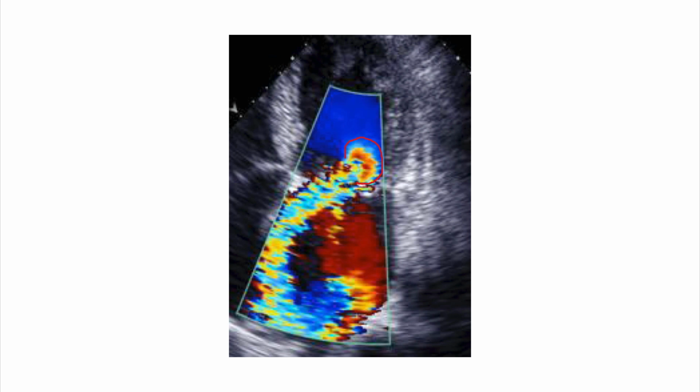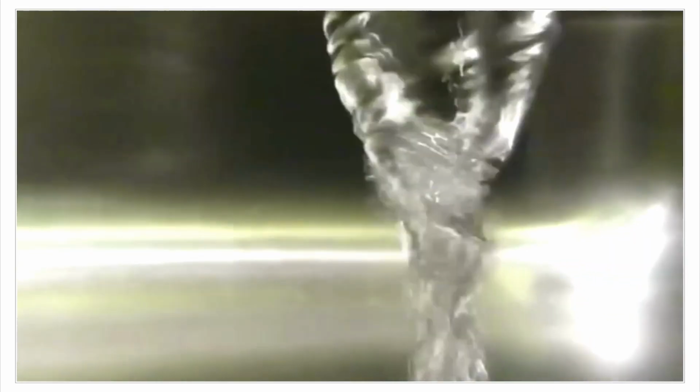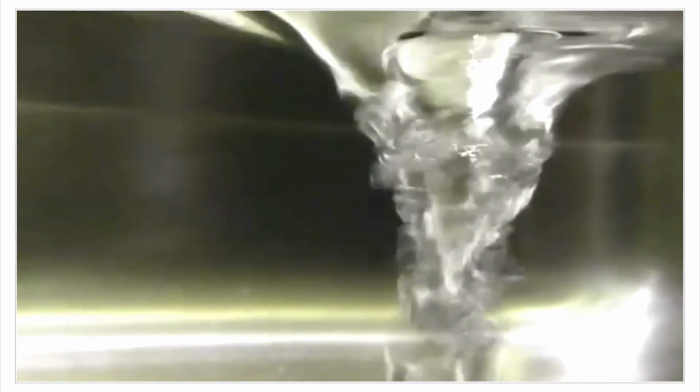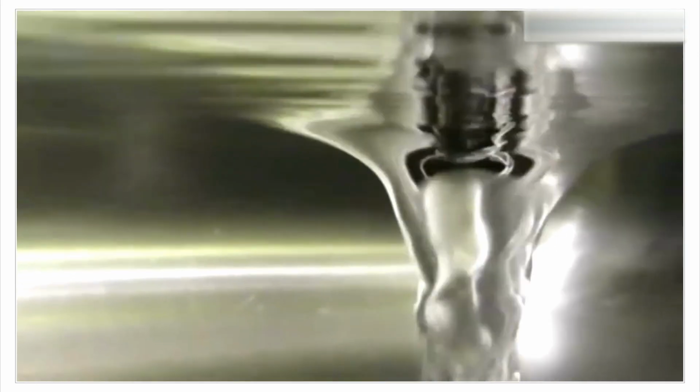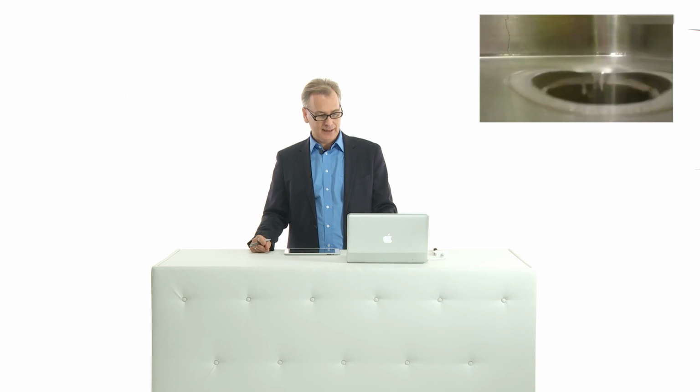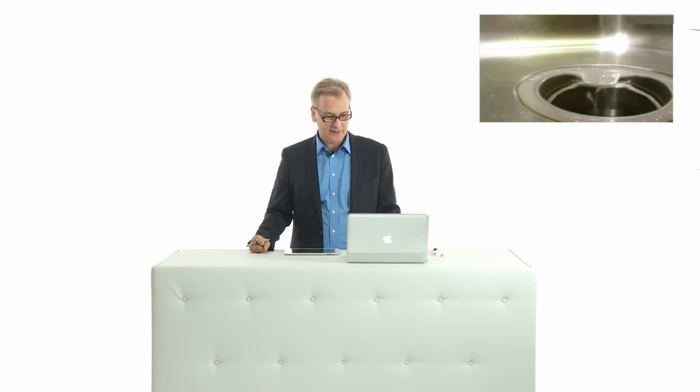Why do we have such a flow convergence zone? The following video will show this to you. This is a sink filled with water, and now we're pulling out the plug of the sink. And you will now notice that water is streaming to the opening, and that the flow of water increases in velocity the closer it gets to the sink. If you know how high the flow of velocity of the water is, then you can actually estimate how much water goes down the sink and essentially even how large the opening of the sink is.